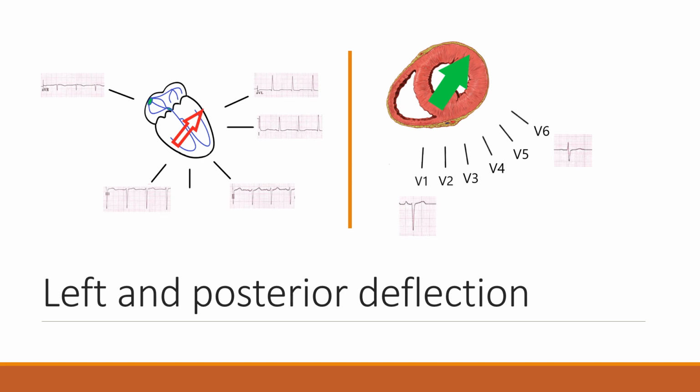I've mapped it out and overlaid the patient's ECG. I cut the EKG and placed it based on each lead's vantage point. So you can see here, because AVL has the most upright QRS complex, and the QRS represents ventricular depolarization, that's telling me that it's moving up and to the left. And then you can see that lead 3 is down.